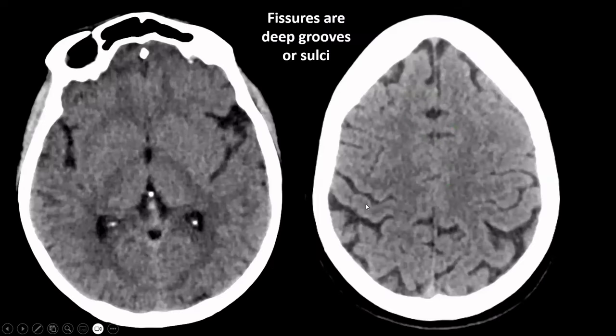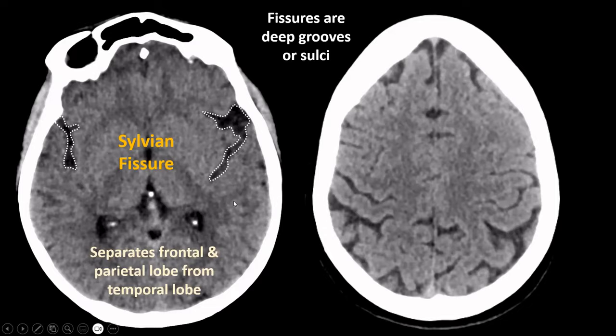If we have very deep or important sulci, we call those fissures. And there are two fissures you should definitely know. The first one would be the Sylvian fissure, and the Sylvian fissure can be seen over here. It is the fissure separating the frontal and the parietal lobe from the temporal lobe. And over here we find the insular cortex underneath the Sylvian fissure.